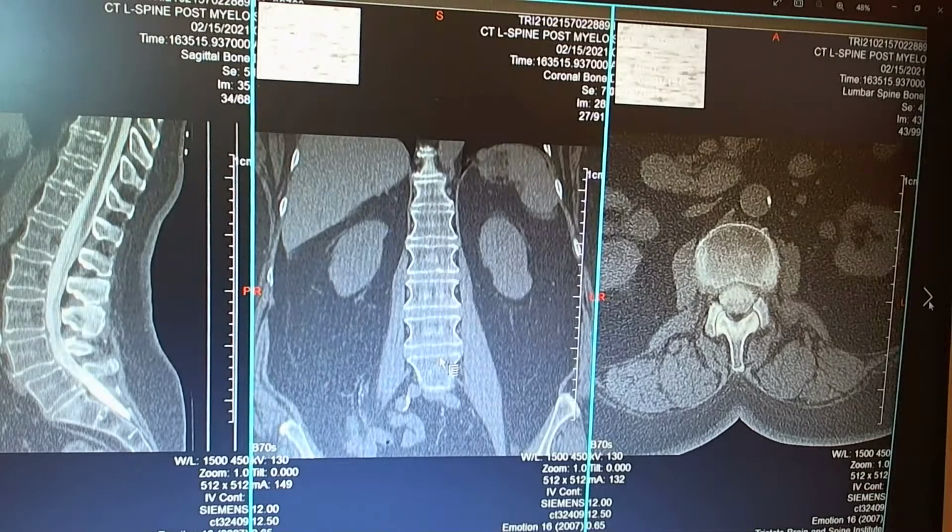Okay, here we go. Let's get a little away from the spine, not concentrate only on the spine. Again, air in our intestine. What is that less white material that practically encases all our intestine inside?